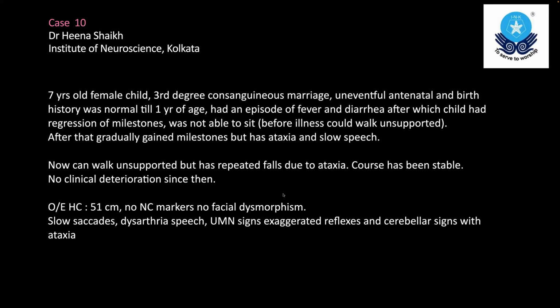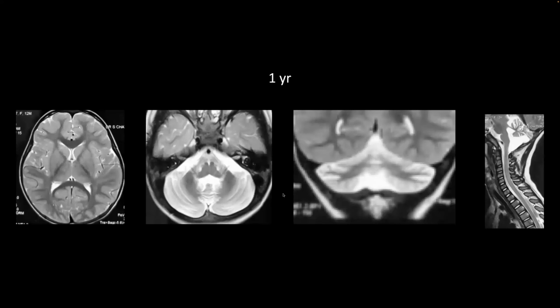All right. Yeah, I can show the images. Can you see? I have just selected images from when the child was 1 year old, and the primary abnormality, as you can see, is in the cerebellum: extensive cerebellar atrophy, possibly the cortex is hyperintense. I don't have a FLAIR with that, but the supratentorial brain appeared to be normal, at least on that image. The deep brain nuclei were normal. There are no white matter abnormalities, but predominant cerebellar atrophy.